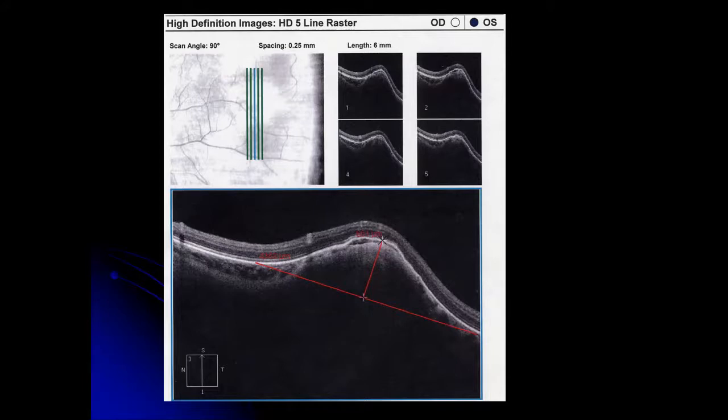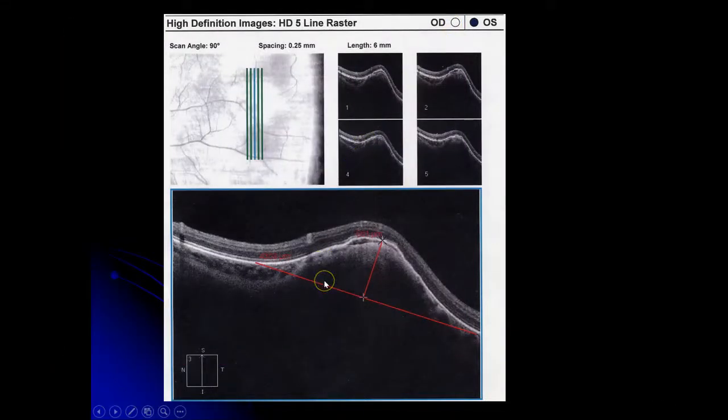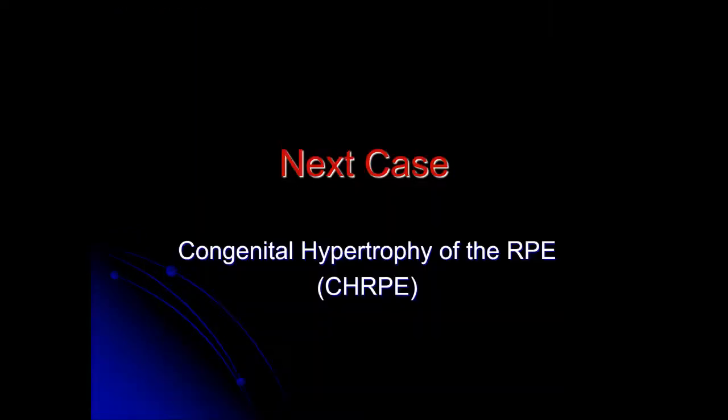We probably should get a fluorescein angiogram, a retinal consult, and probably a systemic workup for the granulomatous type of diseases that we talked about, toxoplasmosis, and we talked about toxo, certainly a possibility. Go back one more time. That slide. Sarcoid in a black individual would be certainly possible. Syphilis can look like anything, can look like this as well. So there's a lot to consider in this case. So this is a case that I would not dismiss. I would have this patient worked up for various of the etiologies that we just discussed.